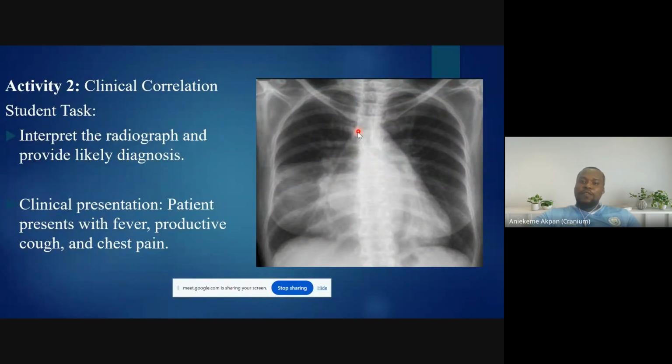If you look at this now, you can see this radiolucency, which is air, of course, inside the trachea or inside the airway. You can see it going all the way down. Raymond, since you didn't see it clearly, look at this now.